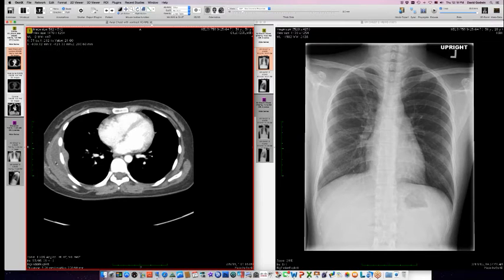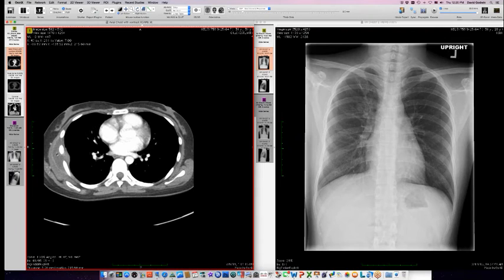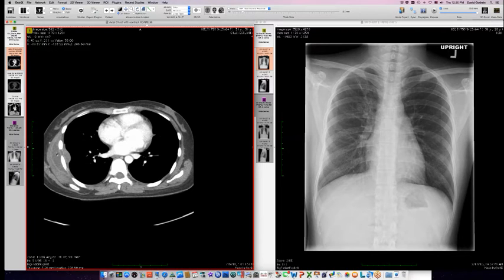People were busy calling this empyema necessitans, which I think is a misnomer. That should mean an actively draining focus. It's possible that this chest wall fluid collection would have fistulized and drained from the skin, at which point it would be a necessitans, but it's not really empyema as much as it is a chest wall abscess necessitans that was future, not current. So Rachel Edwards showed me this case.